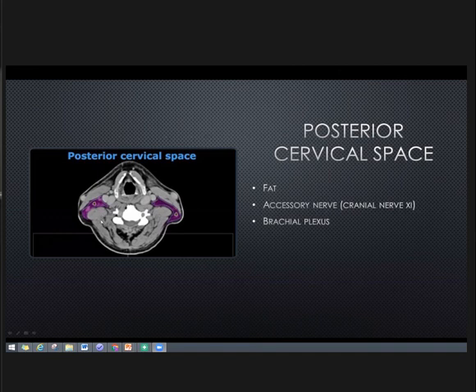So that space would encompass both supra and infrahyoid neck regions. Okay? Same thing with the suprahyoid neck. Just know the location of the lesion, and more or less you can give a good list of differential diagnosis.